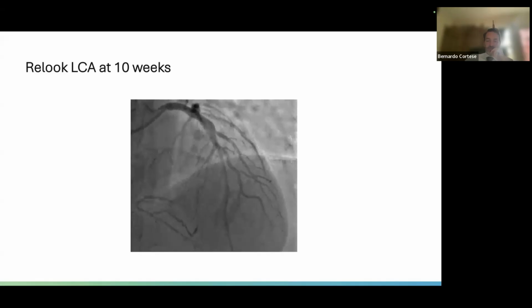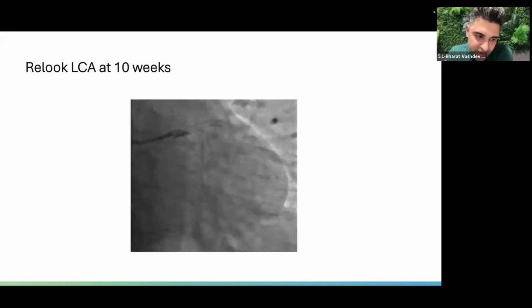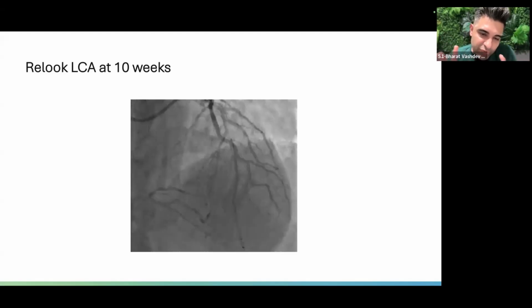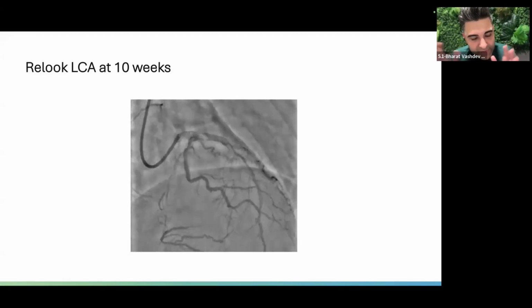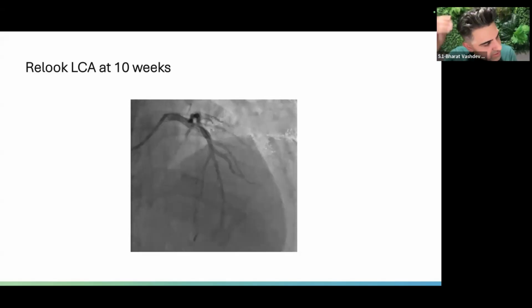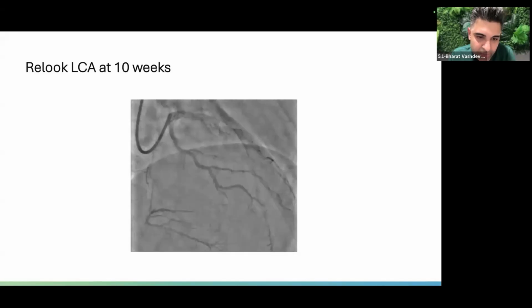Nice. All right. And it's really a similar concept. You prep the side branch, and then rather than using a compliant balloon, you use a DCB, and you inflate the DCB first. And when you're 45 seconds done, then you inflate the stent, and then deflate the stent balloon, deflate the DCB, remove the DCB, do the POT, and the results are quite nice. I also did some bench model testing with the heart models and showed that the deformity is quite minimal.